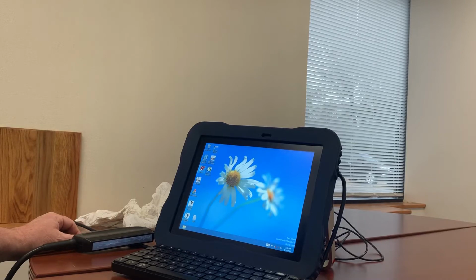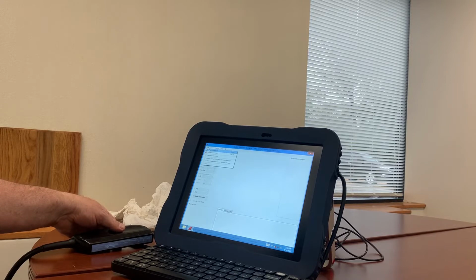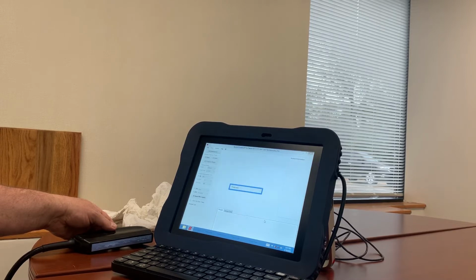Biotronics. We're going to open Biosoft Toolbox 4.0, and we're going to start a new scan session. And we're going to wait for it again. It's good practice anyway for people, so be patient, it'll get there.